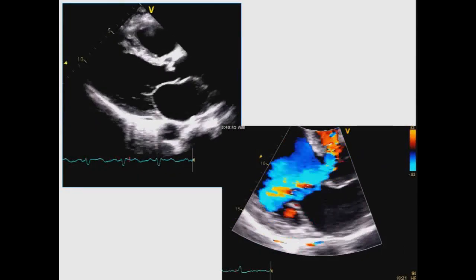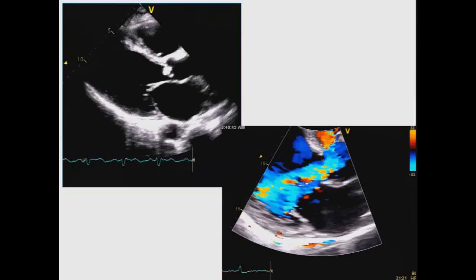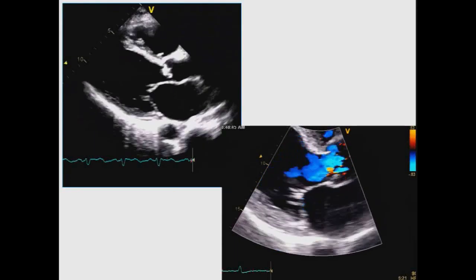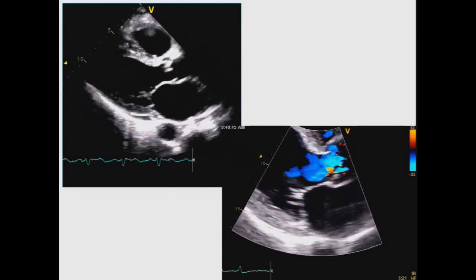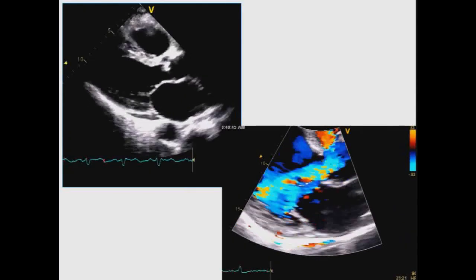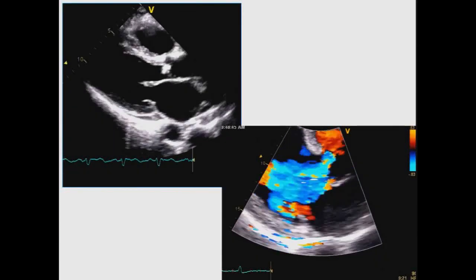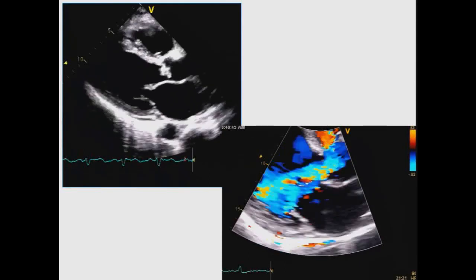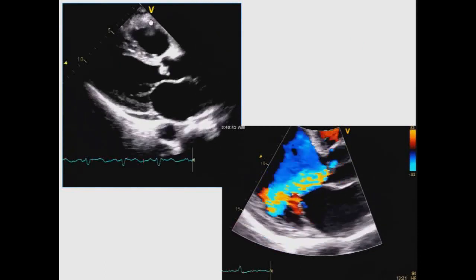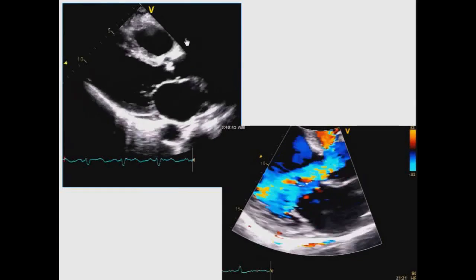Okay. What is the percentage of patients with epicardial fat? Why anterior to the right ventricle and not elsewhere? Increased incidence parallel to the obesity epidemic. I'm not sure we cover fat in this course, but there's no question that you see the fat best in this view here. And the people who have studied epicardial fat look at it right here to make their measurements, actually a little bit closer to the outflow tract.